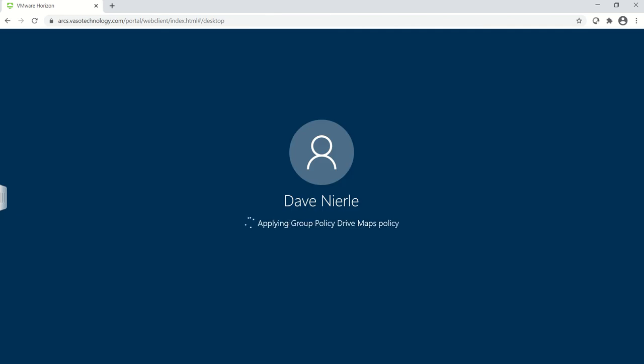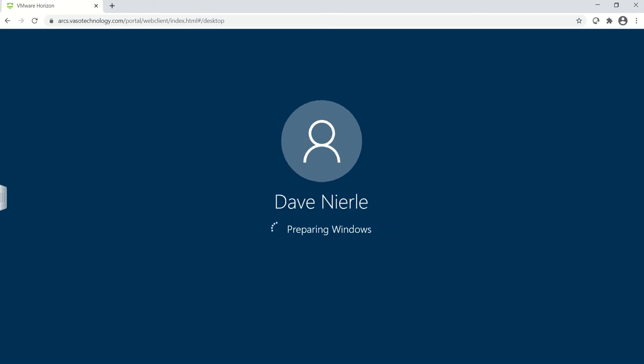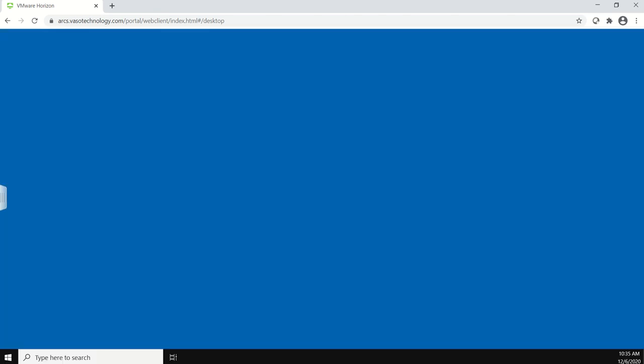And during this minute, while it's setting up the virtual desktop, it will also provide you access to the network, implement licenses for both Microsoft and Vasomedical for ARCS, set up security, and get the desktop set up for ARCS, File Explorer, and also a web browser. In this case, they set it up with Microsoft Edge. So if we give it about a minute, you'll see the desktop come alive. And ARCS, by the way, will open automatically. In fact, we'll already get started on some demonstration before it comes open.